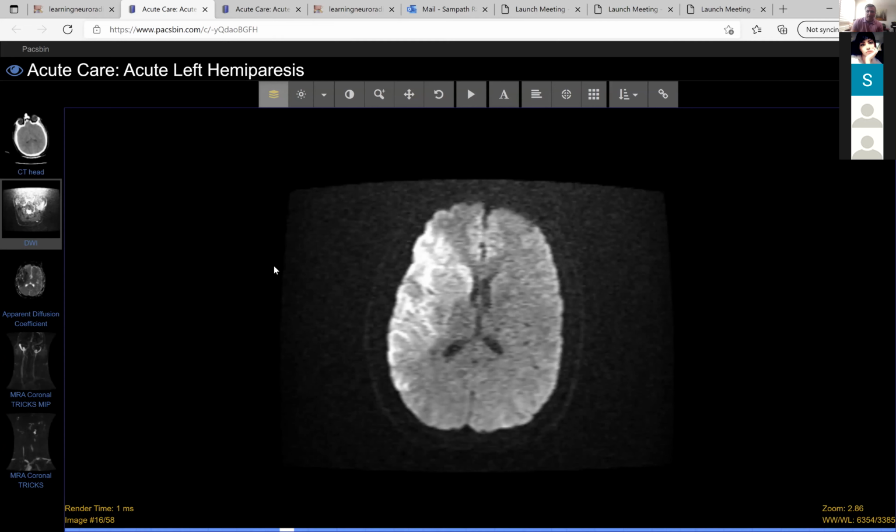Sometimes for ischemic infarct, we have limitations on what we can see on CT, especially if it's an early infarct. So it's extremely important that you keep that in mind when you look at a CT. You have to correlate with the patient's symptoms, and that's why we pick up the phone, we call the patient, and we talk to them and ask them how bad these symptoms are.